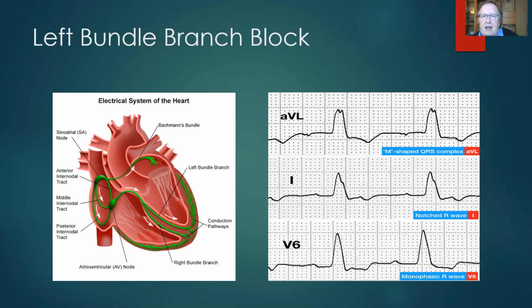And so we see there the notches appearing, and that is because the right ventricle starts to contract and then it causes the left ventricle to contract, and that all takes time. And of course, if ventricles contract abnormally, they relax abnormally, and we have an inverted T wave. Next slide, please.